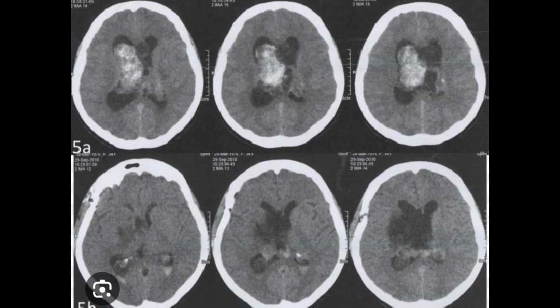On these CT images you can appreciate that the ependymoma is arising from the lateral ventricle on the left side and causes significant hydrocephalus because of the compression effect. Ependymoma is always arising from the ventricle, usually the lateral ventricle or fourth ventricle. Sometimes it arises from the floor of the fourth ventricle. Here in that case you can see that it has already involved the right sided lateral ventricle.